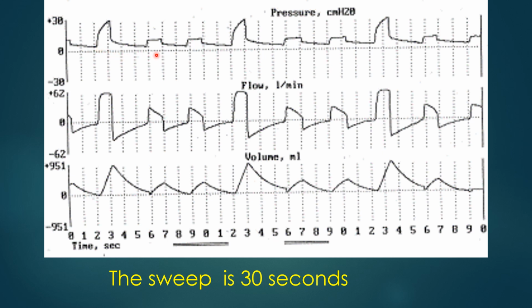And how much spontaneous breathing is the patient doing? Well, it looks like 2 breaths for every ventilator breath. And if that's consistent, then the spontaneous respiratory rate must be 2 times the ventilator set rate. So this is 12 breaths per minute spontaneous and 6 breaths per minute mandatory. So the total respiratory rate here would be about 18 breaths per minute.